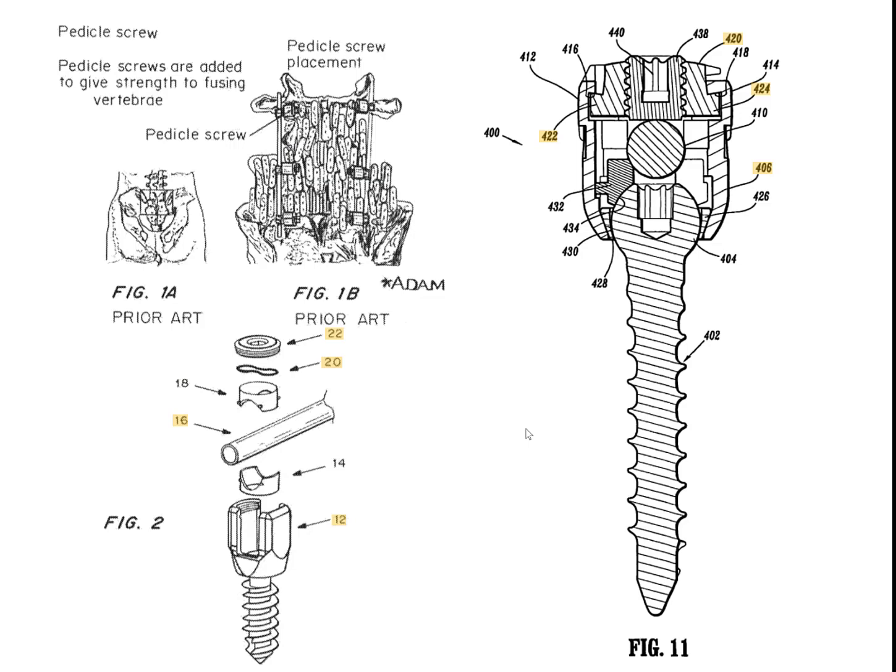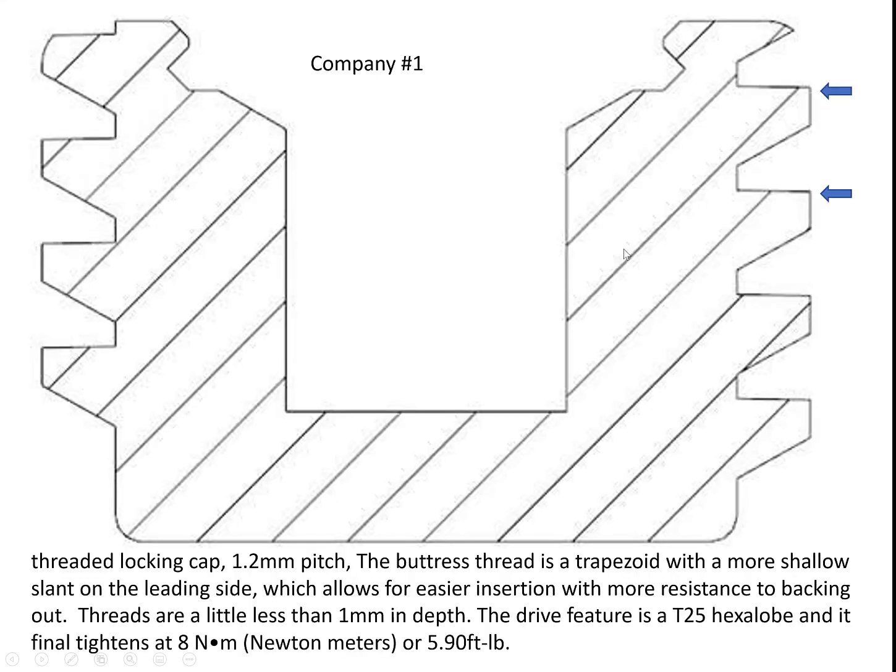So I also want to go over locking caps. This is some patents of different locking caps that I found on the internet. And this is the exact locking cap that this patient has. I learned a lot about locking caps with this case. It's kind of interesting. I'm not going to say the company. I would say company number one.